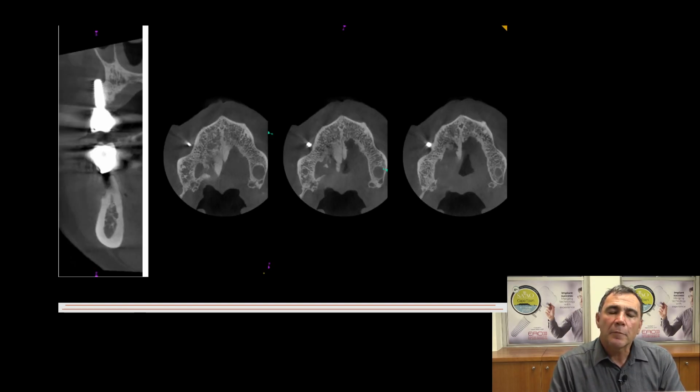One of these is that sometimes implants are not quite accurately placed, maybe because of inadequacies of surgeons or maybe inadequacies of radiology, because if you took a normal x-ray of this implant, it actually looks quite favorable and well in the bone. But obviously I do not have to show you where this implant is actually placed.